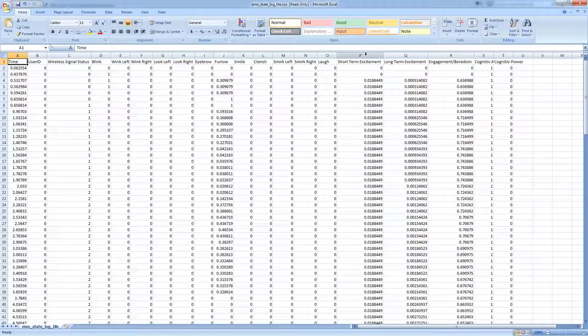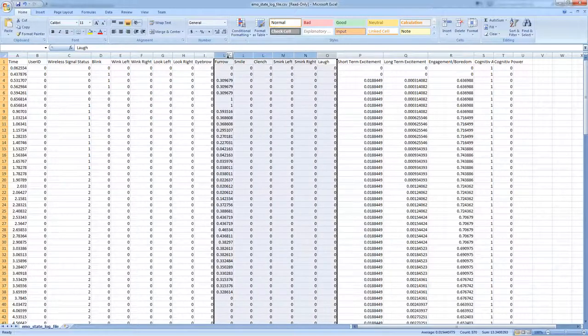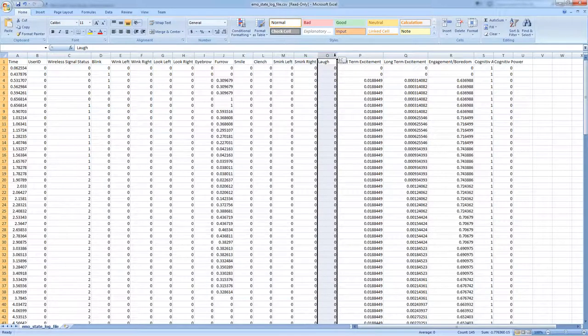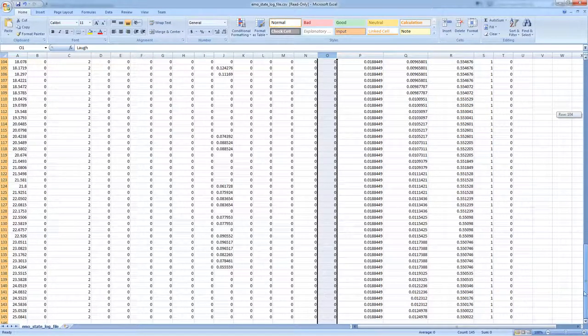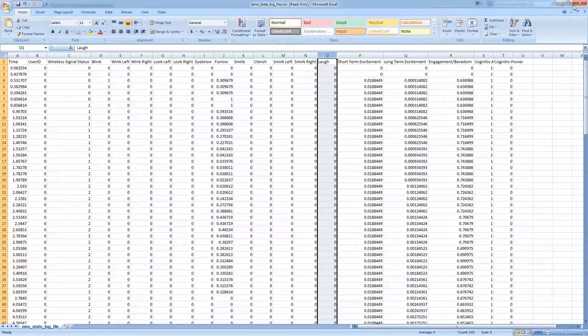So we have some affective detections and all of the expressive detections for different facial recognition. You can see we have about 25 seconds of this data. This code example is a good starting point to show how to retrieve this information from the engine.